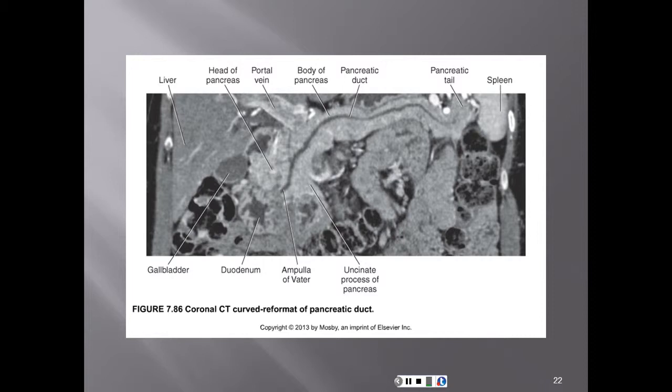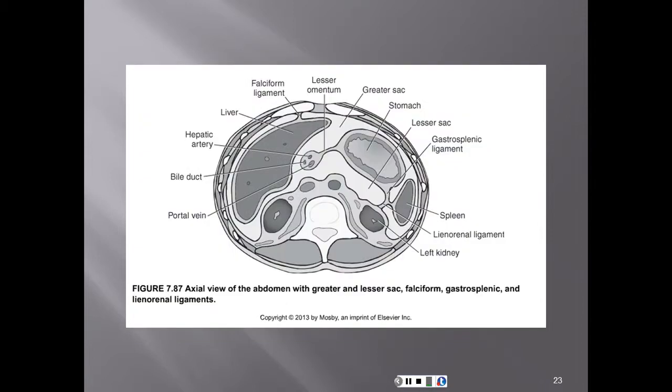There is a pathology called the small bowel feces sign, which indicates a large bowel obstruction that has backed up fecal material back through the cecum and retrograde into the small bowel.